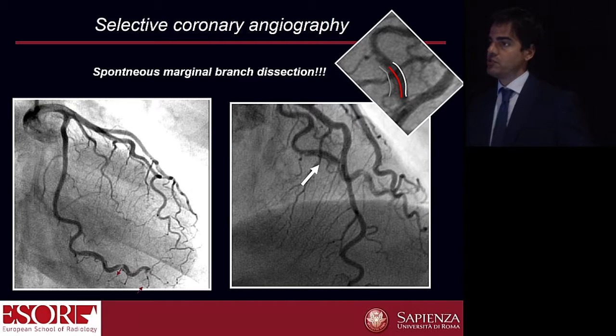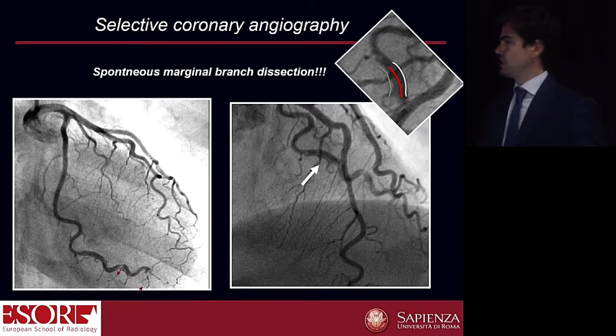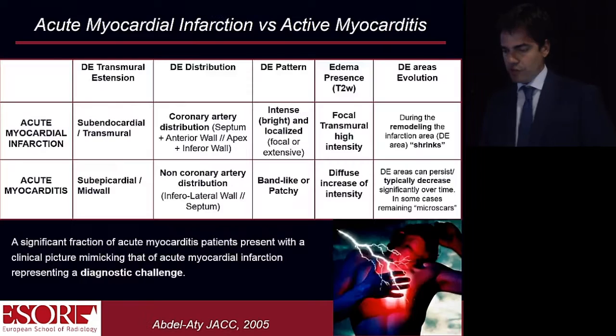She had symptoms of heart disease, mild troponin raise. It was confused to be a myocarditis, but unfortunately, after the exam, it's one of those cases in which we gave the diagnosis of acute myocardial infarction before the clinicians. Cardiologists were not convinced about it, and of course, it was associated with legal implications, and you can imagine, because this lady waited 10 days for having a diagnosis, it was very difficult to do it, but MR gave us a clear insight to what was going on.